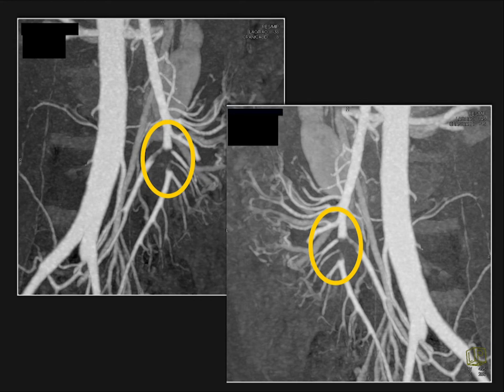And I've seen many of them missed. Like this case, for ischemia was read as negative, and you look at the SMA, it looks good, but only when you look distally at the SMA did you see the clot. And this is an outside scan, and if they would have done sagittal views, SMA looks great two thirds of the way. The last third is what's going to kill the patient, because then you see evidence of thrombus in the SMA, and the vessel is going to be occluded. Just a very nice example.